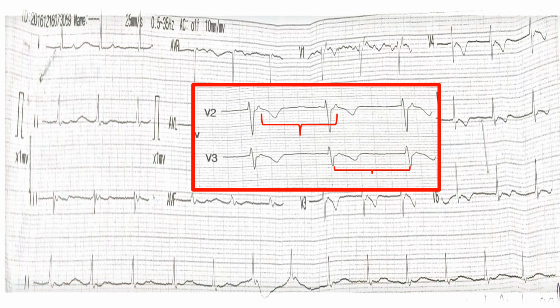So now the P to P interval is 55 beats per minute, or the atrial rate is 55 beats per minute. So this means the atria is not firing quite well. This appears to be some kind of pathology going on. That's what caused the sinus rate to slow down. In normal healthy hearts, it should be more than 60 beats per minute. So this is marginally low, but definitely anything less than 60 needs to be looked into for any pathological causes.